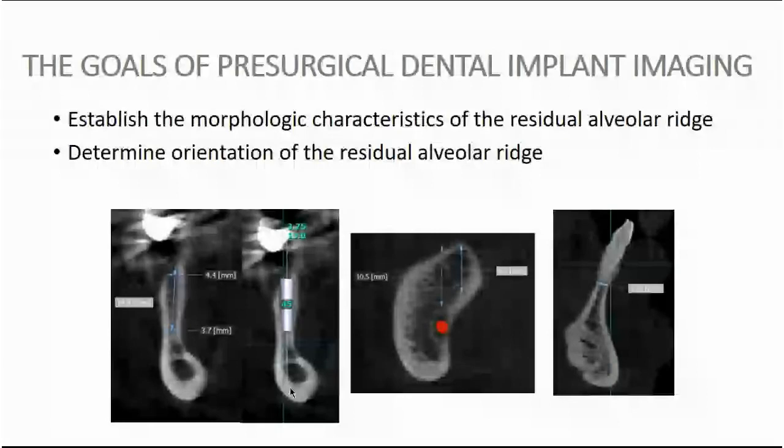So the undermined situation here will show us what size or direction of the implant we will be able to choose.